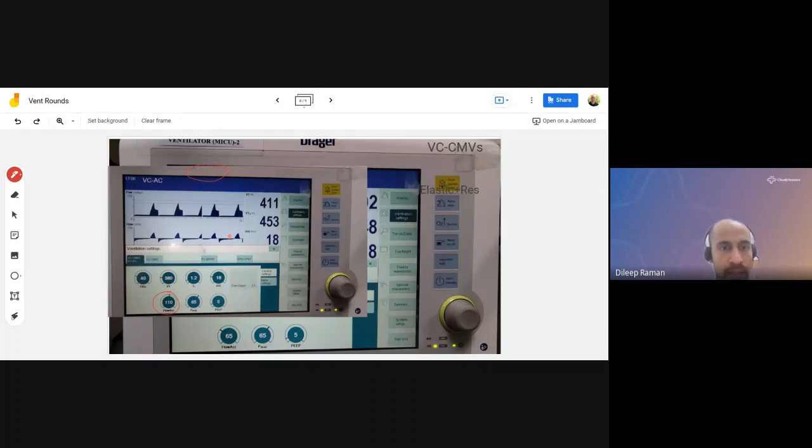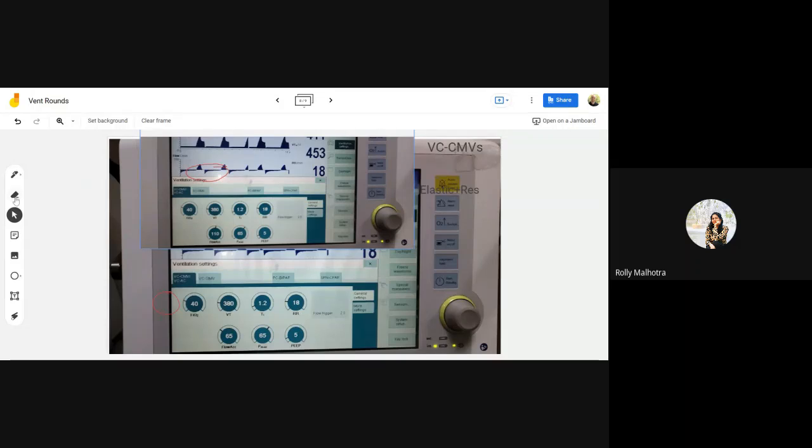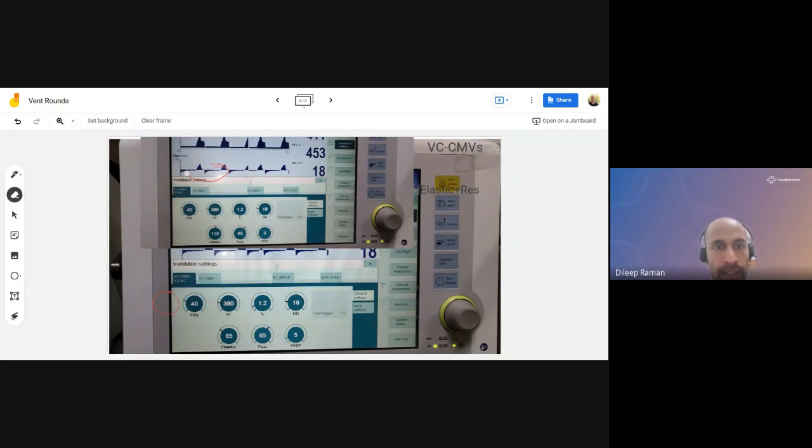And that's exactly happening. So you can see here, this is the second waveform. This is the waveform with the flow ACC at 110. Okay. When it is at 110, that means 110 millibars per second is the pressurization speed. Right. So if you're doing it at that speed, what you're going to see is that, like you said, the tidal volume is reached faster, and the TI is still 1.2 in both. So look at the gap here. There is a gap, and here there is no gap. Yes, or very small gap. So that's what's happening here.